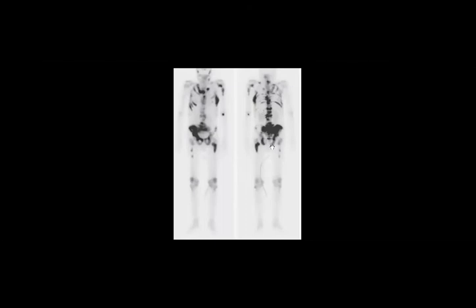We like to mention that when you make the follow-up, in this case in the bone scan, do you look for the increase in the uptake or the number? When you have a follow-up in this image, you look for the number, is it increased or decreased, or the uptake?